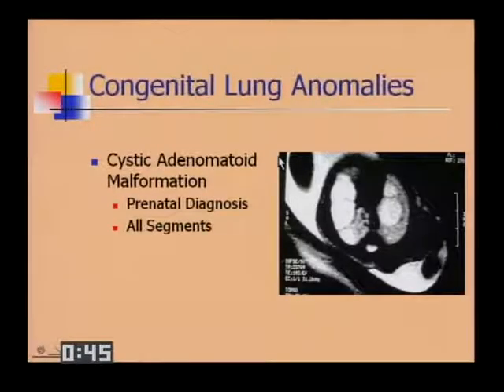There are a host of congenital lung anomalies. Many of them, most of them now, are diagnosed prenatally. They are suspected on the basis of ultrasound, and then additional imaging is performed. This child is the first child that I've ever had the advantage to see prenatally, and the increased area, these very bright areas, are actually bilateral congenital cystic adenomatoid malformations.